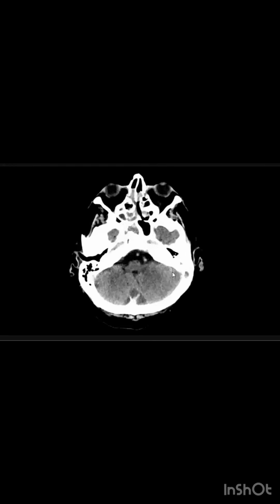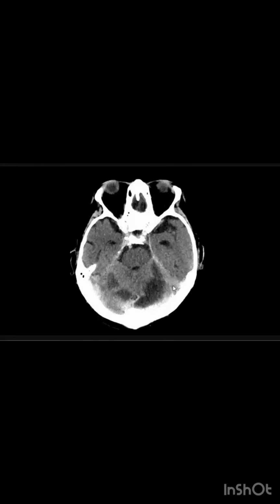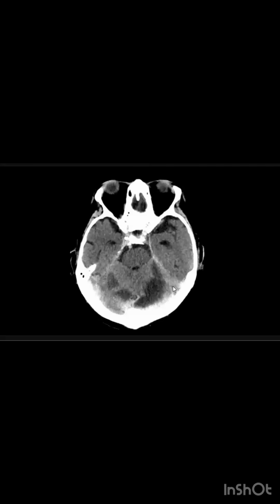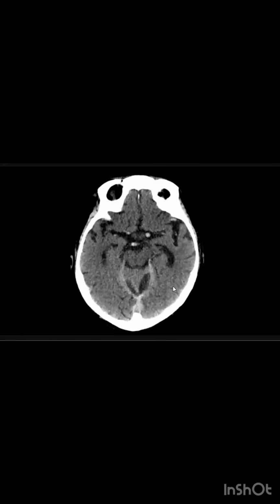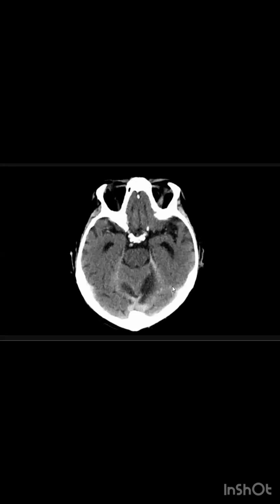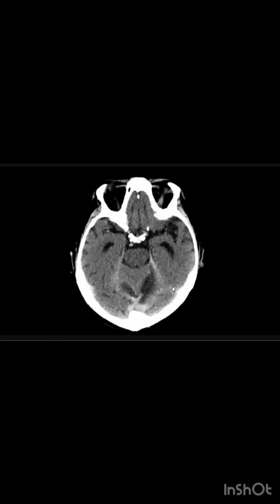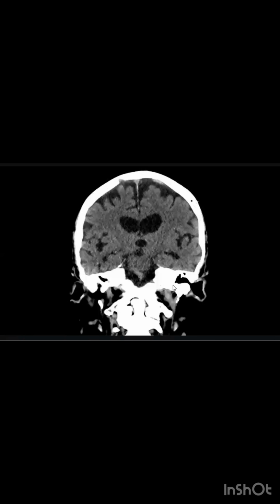What is your suspicion in this patient? These are extra-axial and are peripherally enhancing, and are seen along the tentorium also. So these could represent subdural collections, but I will like to see it on the coronal and sagittal reformatted images as well for further evaluation. The coronal, but without contrast.